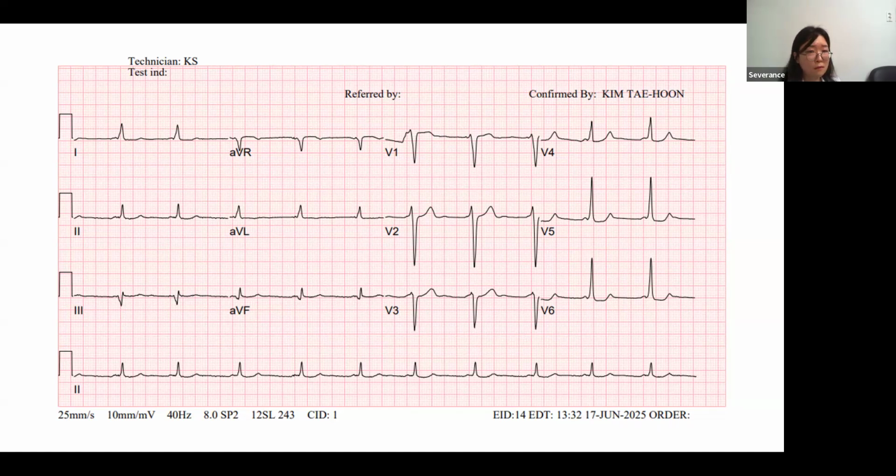In addition, there is some subtle ST segment depression in the more lateral leads, which suggests repolarization abnormalities. However, this may be common in patients with accessory pathways, so it may not really be suggestive of ischemia. I agree that the accessory pathway is on the right side.